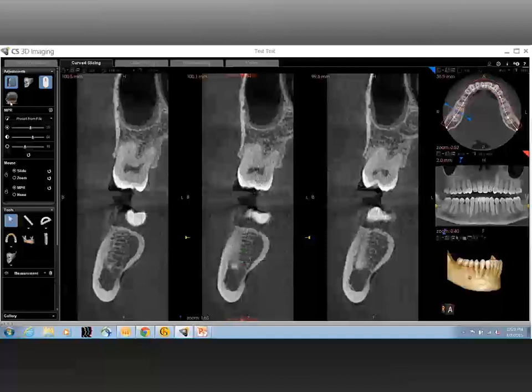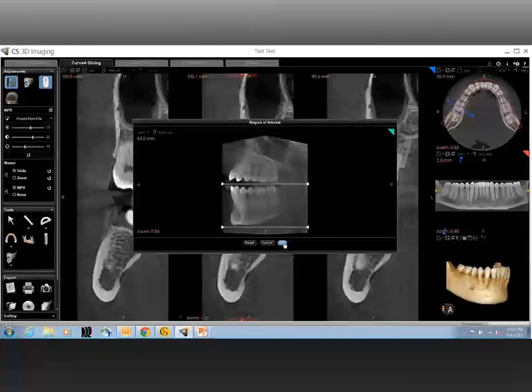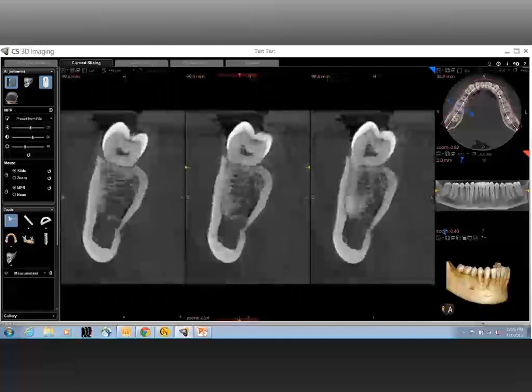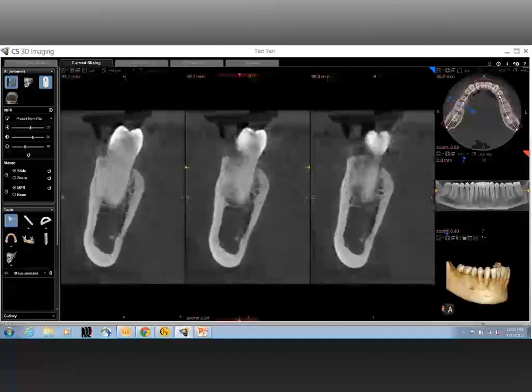Now, once the angulation of the ridge has been analyzed, and I again emphasize it does not necessarily have to be in this order, you have to critically also view the morphology of the ridge. So the morphology of the ridge is nothing but you have to identify all the borders of the ridge, and as you all know very well, borders can change. The shape of the morphology of the ridge can change, especially the crestal bone.